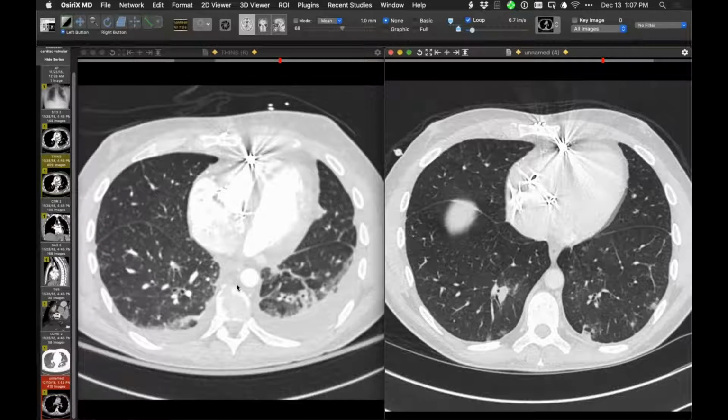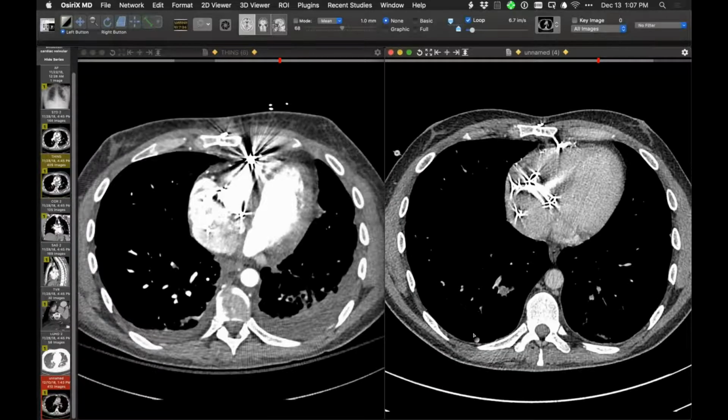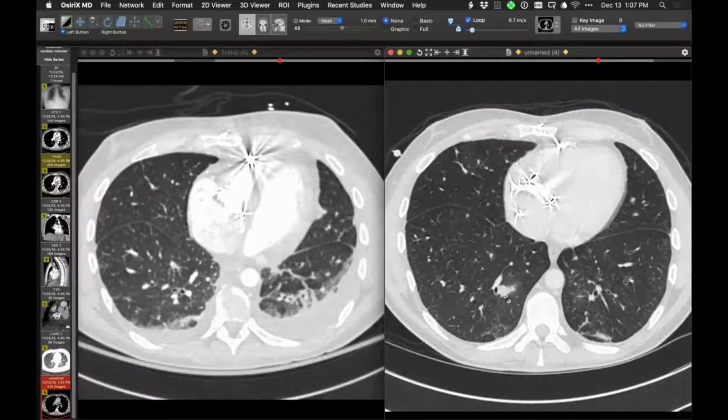Now, where there was a normal vessel before, right here, opacified, now we have this. And if I go to the window like that, there isn't great opacification, but obviously those vessels are now bigger and they're quite gray. But again, on the lung window, there's something new there.